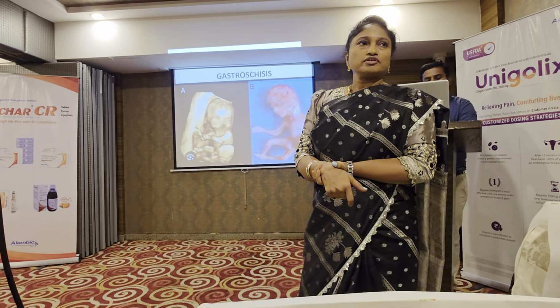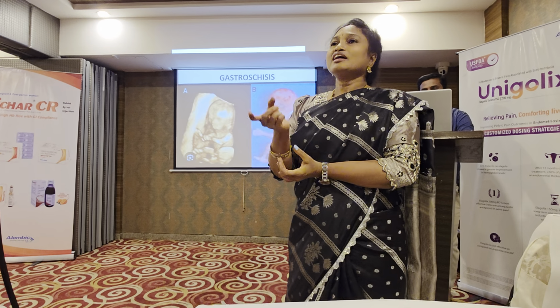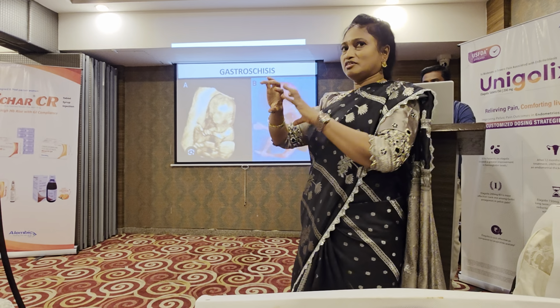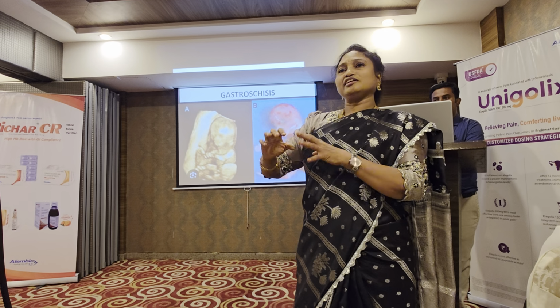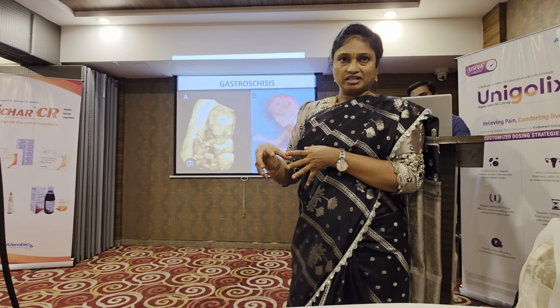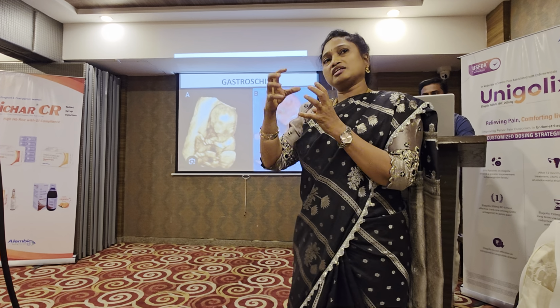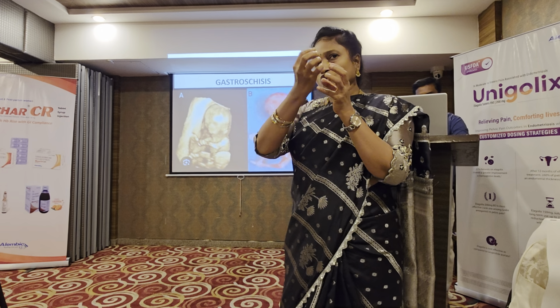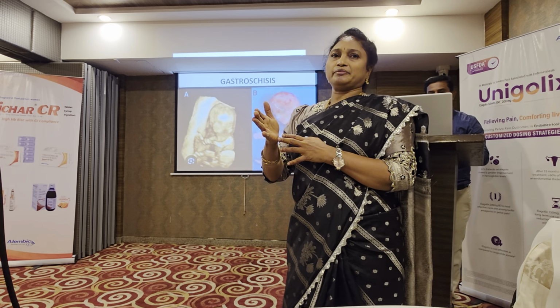So this is omphalocele and gastroschisis. Which is more dangerous? Omphalocele, because it is associated with genetic as well as chromosomal abnormalities. Though it is covered with a nice covering, this is more scary, because gastroschisis is paramedian and is not covered. This is easier to operate. Usually the contents are only bowel. Whereas omphalocele is associated with genetic problems. It usually has a liver as content, and in this we can see from the caudal portion the umbilical cord comes out. Whereas gastroschisis is not in the midline, it is paramedian.